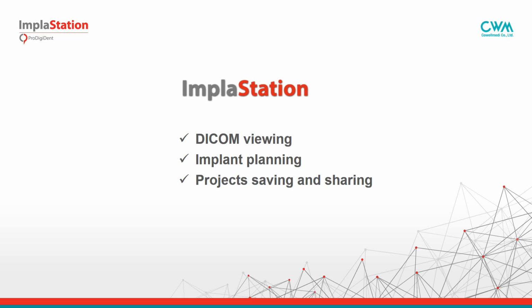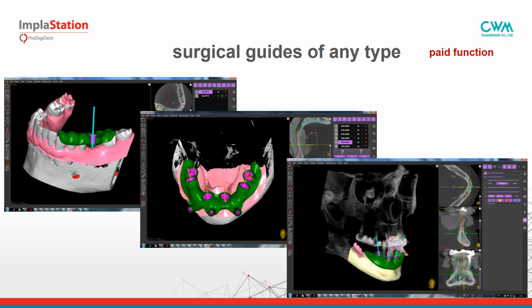Using it, you may view CBCT, plan implant positions, and save and share projects fully free of charge. The main task of the software is the creation of surgical guides. ImplaStation can create surgical guides of any type: teeth supported, gingiva supported, bone supported and much more.